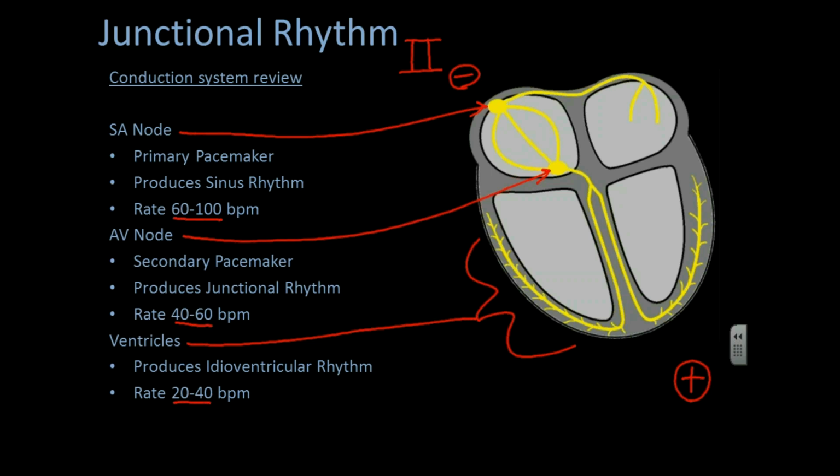So let's look at our paper. Let's draw an isoelectric line down here. It is isoelectrically neutral, so essentially having 0 amplitude. And anything above that line is a registered positive deflection, and anything below that line is a registered negative deflection.